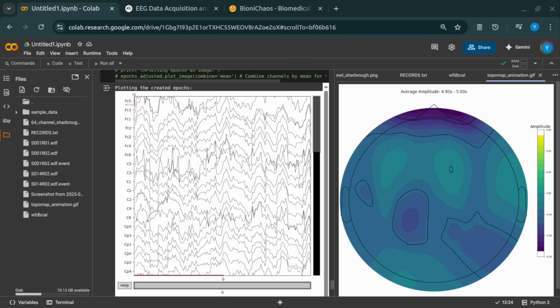Absolutely. This experience really highlights why precision matters so much in data alignment. Even a tiny discrepancy can dramatically change what you're able to see, interpret, and ultimately understand from your data. Mm-hmm. It really underscores that simply getting a plot to appear isn't enough. It has to be a meaningful and ideally a complete plot. Couldn't agree more. So we've debugged the static image. We've got our 36 channels mapped. That's a huge win. We can now get a snapshot of brain activity.